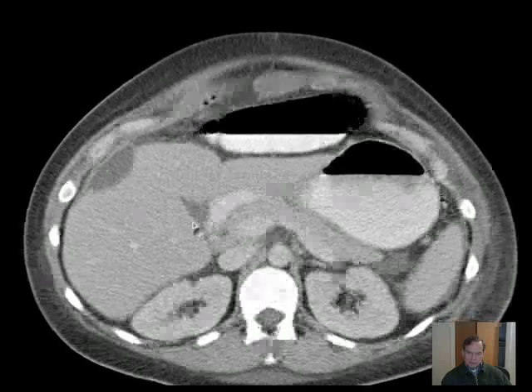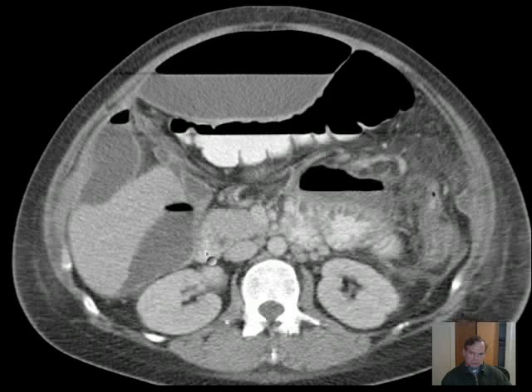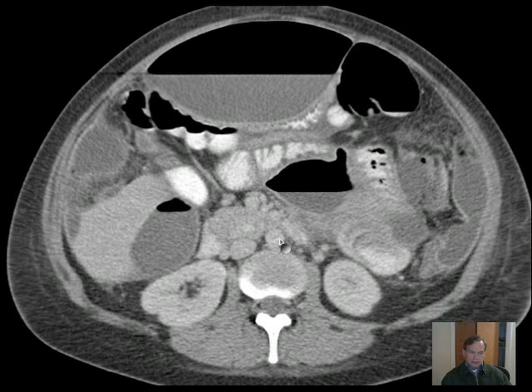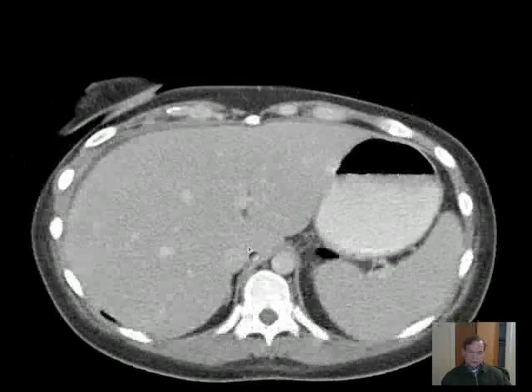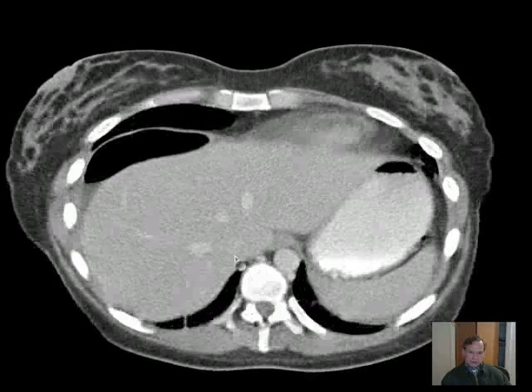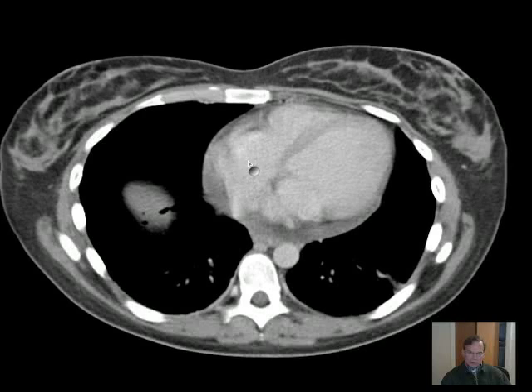The common bile duct comes from the liver down through the head of the pancreas, and that's that little tiny dot right there. Common bile duct, and empties into the duodenum. You see both kidneys here. Here's the abdominal aorta and IVC, which you can follow along their respective courses. The IVC, interestingly, dives into the substance of the liver and then courses superiorly to join the right atrium.